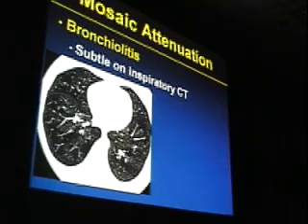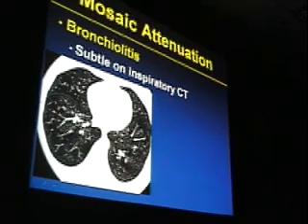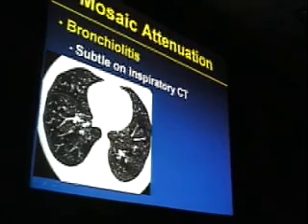Now, in patients that have constrictive bronchiolitis manifesting with this mosaic attenuation pattern, usually on the inspiratory exam, the findings are quite subtle, and I'm not sure how well it projects, but there are alternating areas of high and low attenuation, this being higher, this being lower. Notice that the difference in vessel size here is not very obvious.